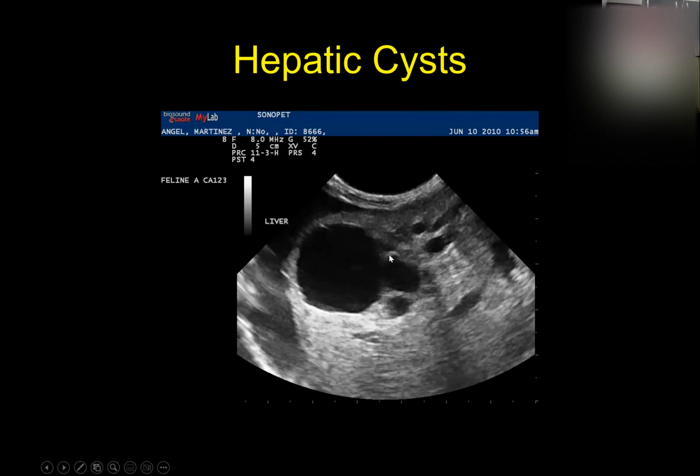Okay. And an abscess is totally different than a cyst. We mentioned before that anytime you see a cyst anywhere, it's almost always benign, but cysts can become fluid filled and they can get really big. And just the size of the cyst could put pressure on other organs that live around it and cause failure of those organs just from pressure of the size of the cyst. So cysts, on the other hand, as opposed to an abscess, are almost always thin walled. Okay. They're either oval shaped or round in appearance. Okay. And cysts contain anechoic fluid. Okay. They don't have echogenic debris inside the cyst.